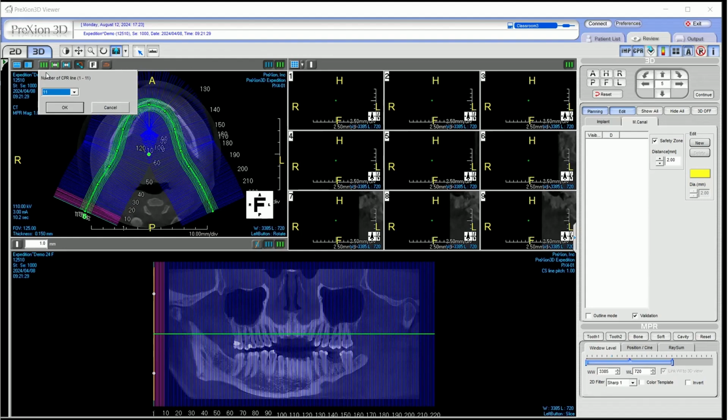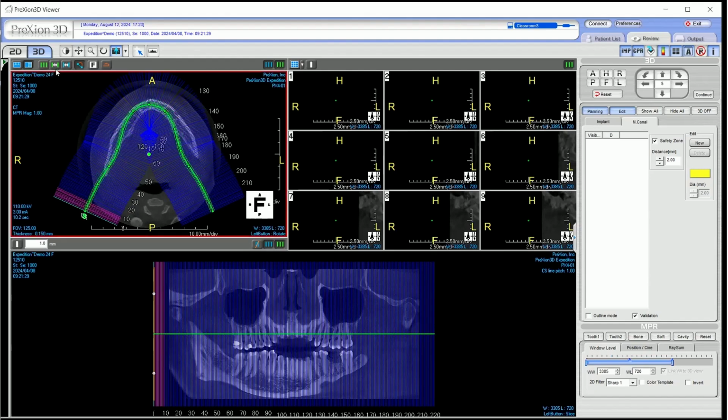Here, you can change the amount of lines that you see along that CPR curve that are running lingual buccally or buccal palatal. You can change it to 5. You'll see that thickness of that CPR curve become more narrow. You can drop it to 7, or 11 is typically what we're working with. So that is what that CPR curve will default to unless it is changed.